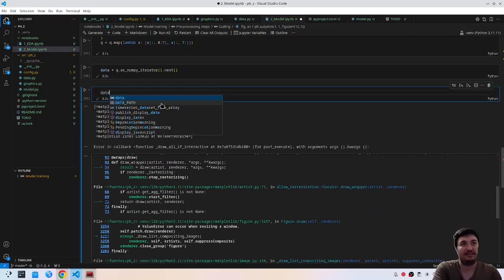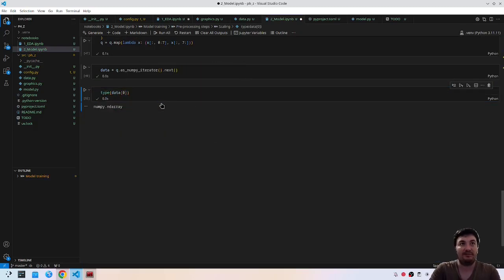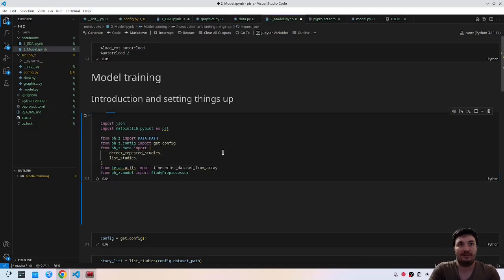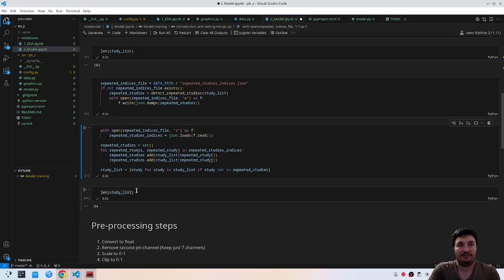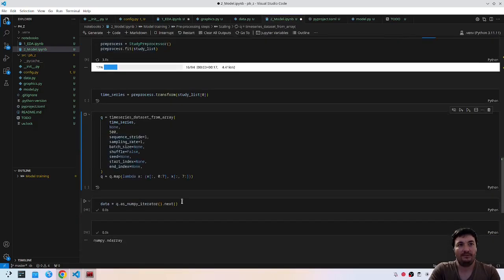No, maybe it's a data type. This is a Tensorflow thing. No. Oh, maybe because I changed the NumPy version during the run. Yes, probably. I killed everything with that. I changed the NumPy version while running everything. It's not a good idea. Okay.